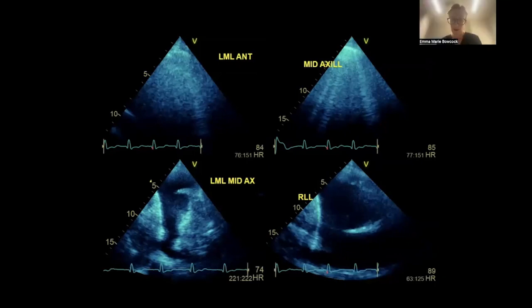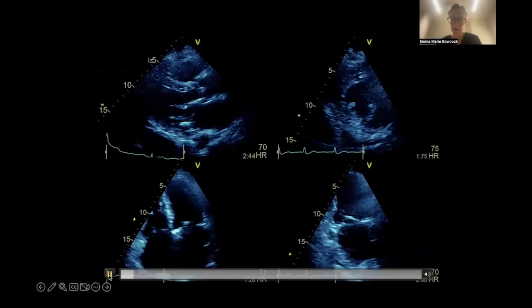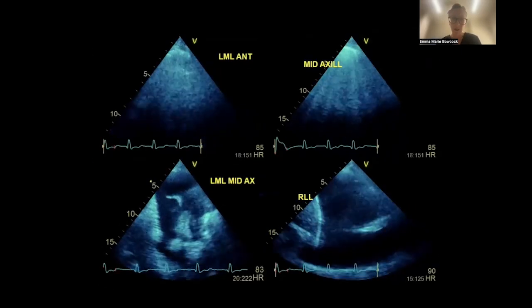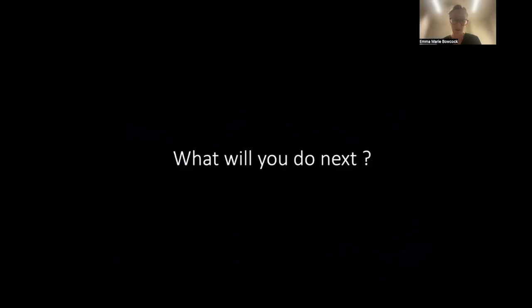And the important thing is that this is all fitting our patient with a heart like this and a rip-roaring left atrial pressure, pulmonary venous hypertension, congestion, wet lungs, etc. So in terms of how you might manage this patient next, any thoughts from anyone? So you've put together your clinical assessment with your echo and lung ultrasound. In conclusion, Ravi, just give me a 1-sentence summary of your findings.